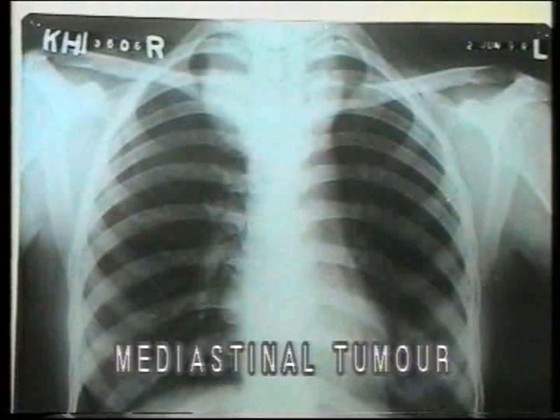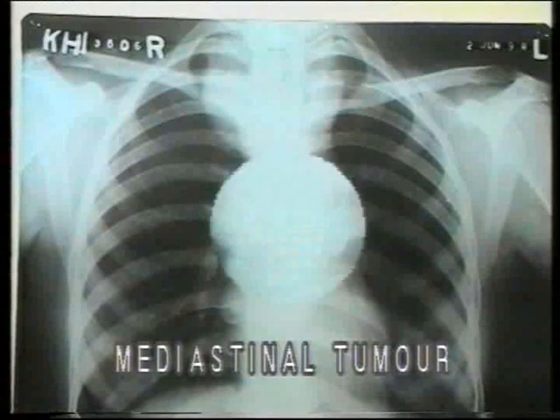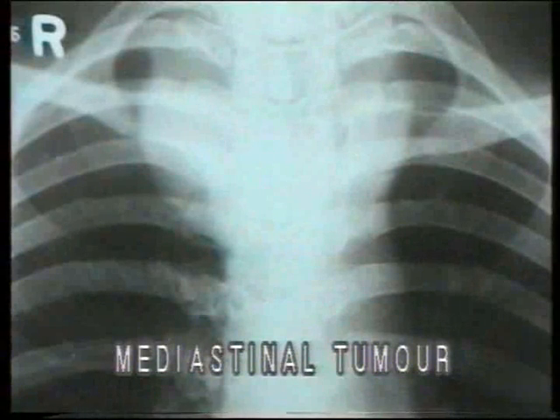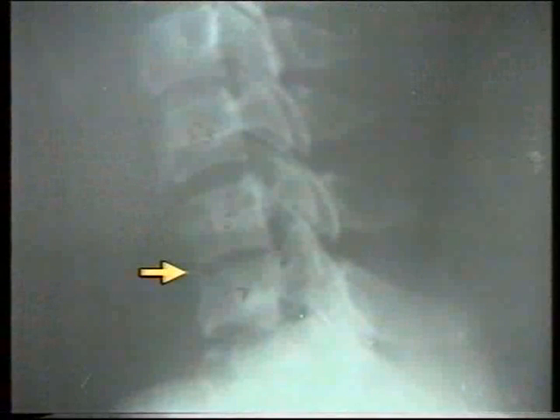Note this opacity in the upper mediastinum. It is bilateral and has a smooth border. It could have been a retrosternal goiter or a thymus if it was in the anterior mediastinum. But a lateral X-ray showed it to be located in the posterior mediastinum. It was a paravertebral cold abscess arising from this tuberculous lesion of the 6th and 7th cervical vertebrae. Note in the lateral view of the spine, destruction of the disc space and adjacent edges of the 6th and 7th cervical vertebrae, a typical tuberculous lesion of the spine.